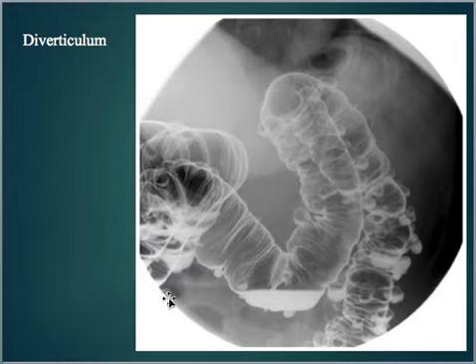This is an image of diverticulum. This is a double contrast study, and again, we can see the air and fluid levels, right? See how this is a nice flat horizontal line of the contrast that's settled down and the air's risen up. This patient is standing upright, I can tell just by that image.